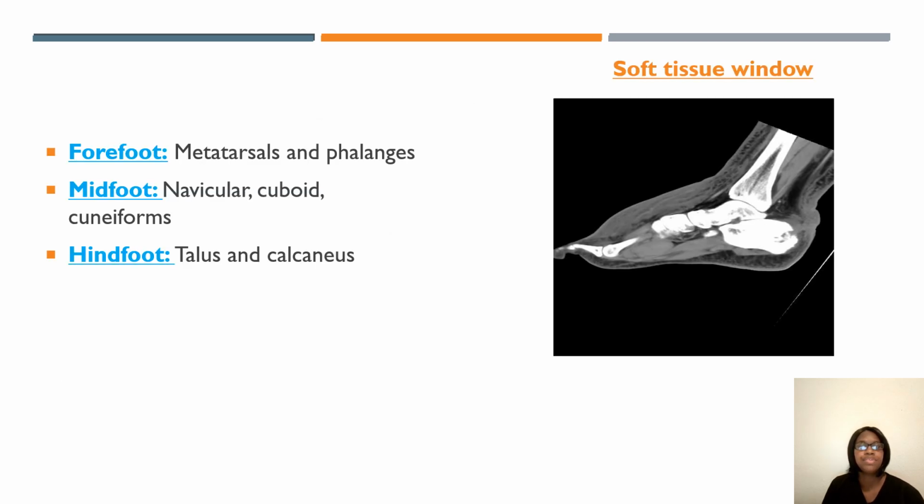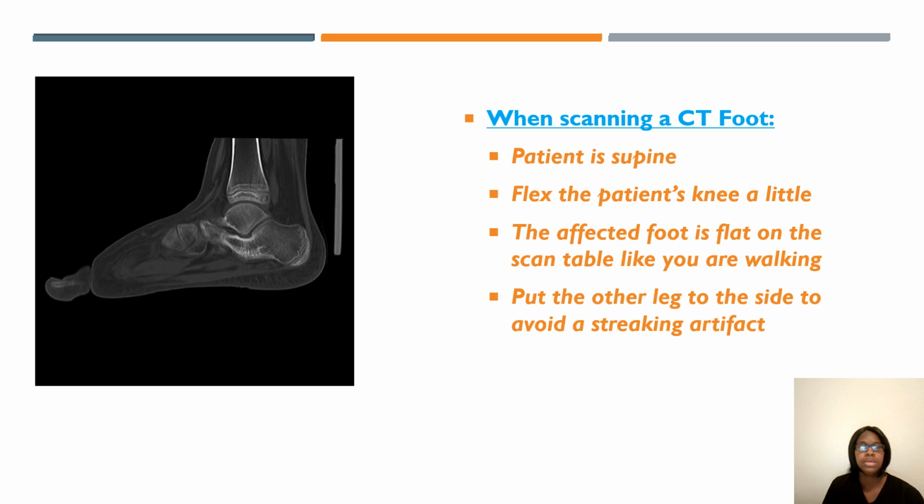And you have your foot. Make sure that you know what is all involved whenever you are scanning your forefoot, midfoot. Know which window level you're looking at, soft tissue window, bone window. You have this foot in a bone window.